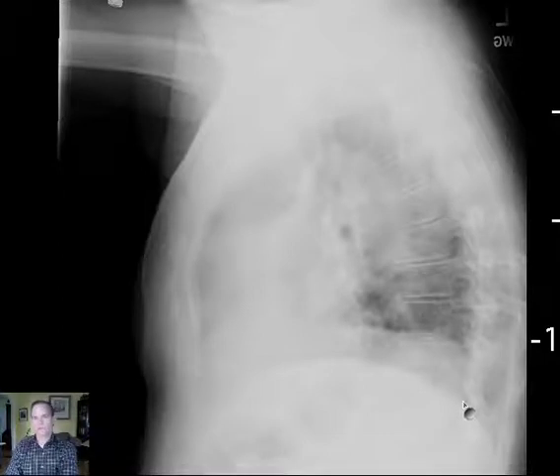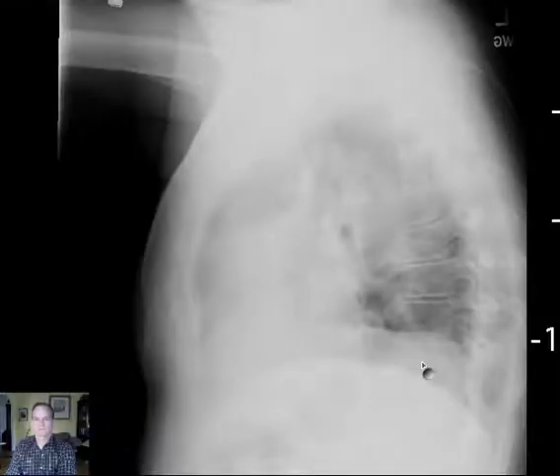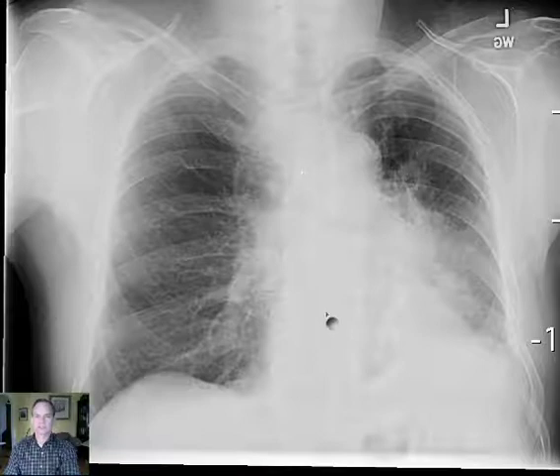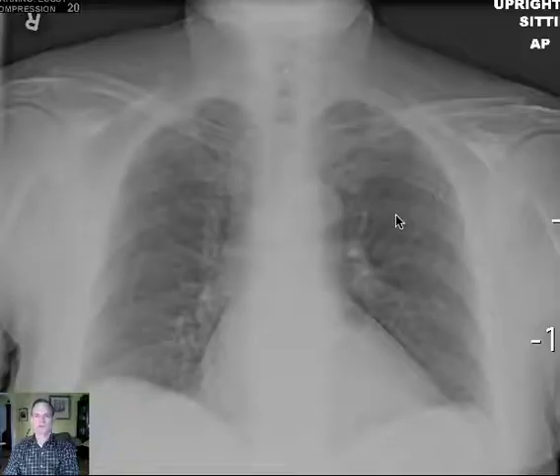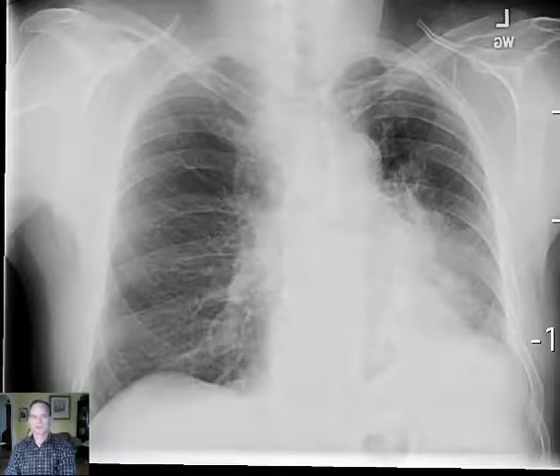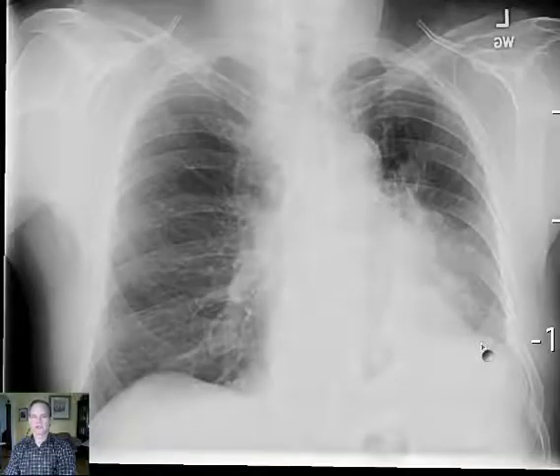On the lateral view, I trust you know which is left and which is right. So there's something abnormal here. What else do we see? Look at the mediastinum on the frontal view. Compare it with this one. See how you have the part of the heart, the right side of the heart, going well to the right of the right margin of the vertebrae there. Not true any longer. And besides silhouetting of the left hemidiaphragm, look what else has happened. It's up.